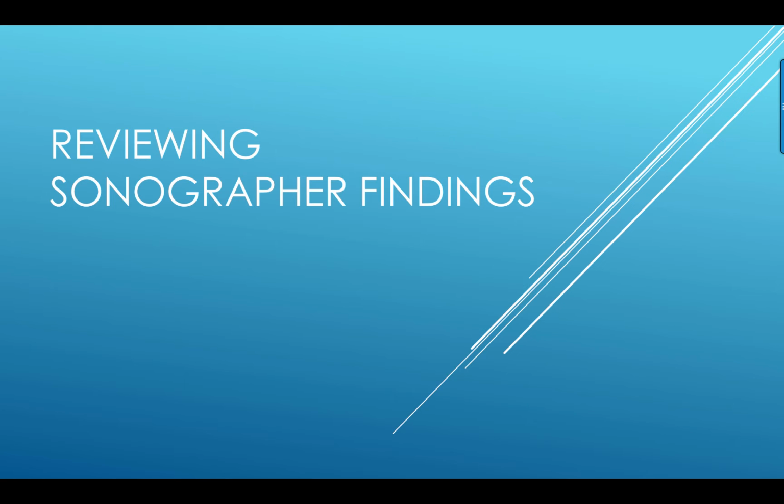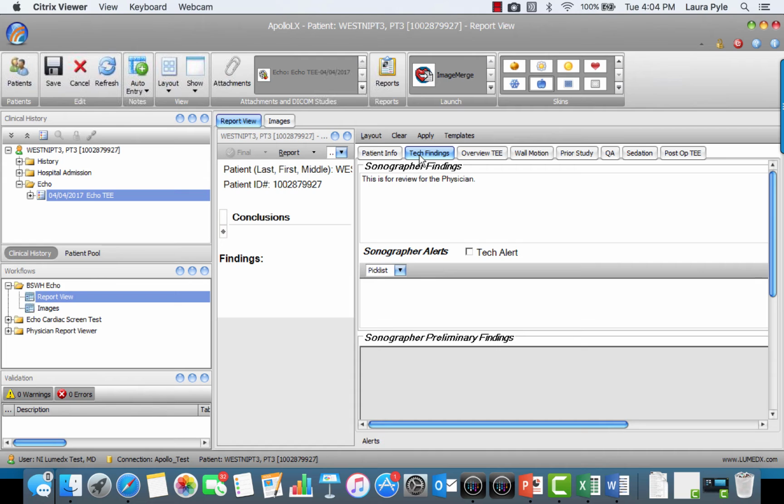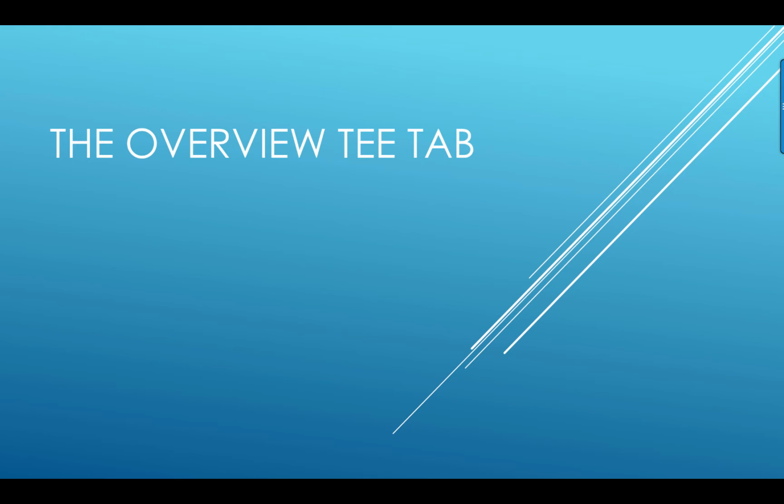Reviewing sonographer findings. Click on the Tech Findings tab to review any communication or documentation left by the sonographer prior to completing your documentation. The Overview TEE tab.